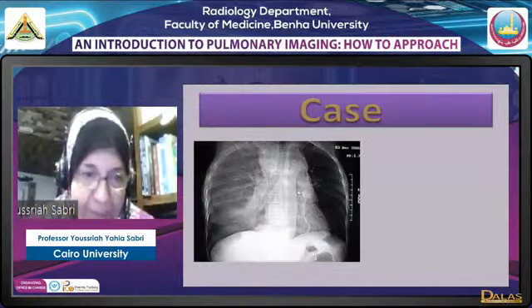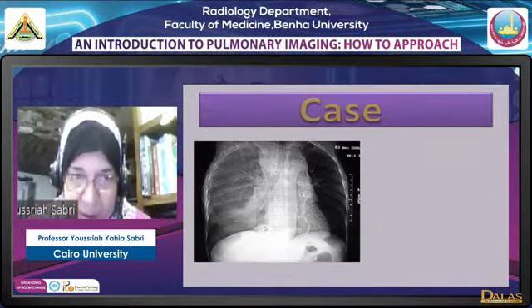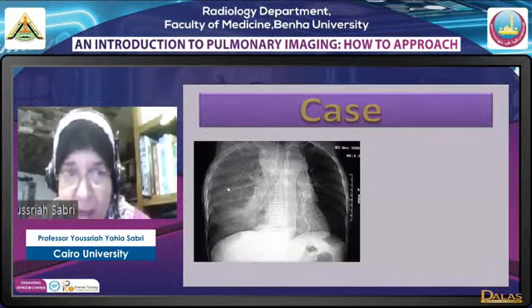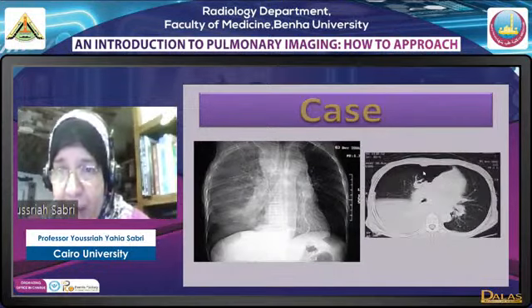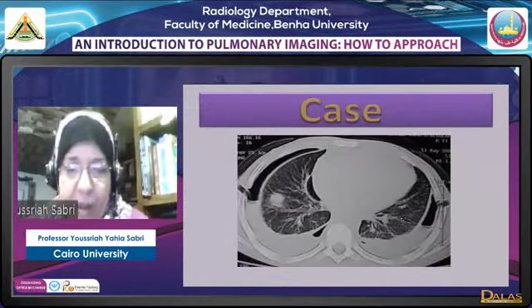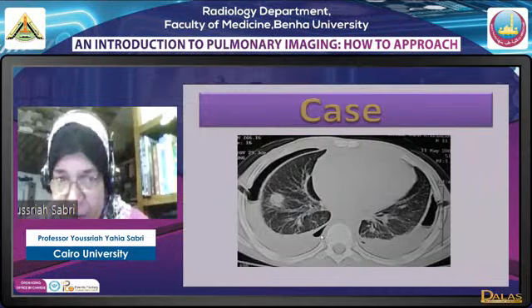What do we have here? We have a deep sulcus sign, a clear diaphragm sign, and at the same time we have veiling and we have capping. So we actually have a hydropneumothorax, air and fluid. We have it bilateral here, loculated, multiloculated actually, because more than one fluid level is seen.